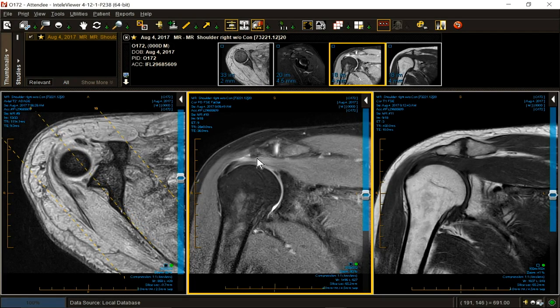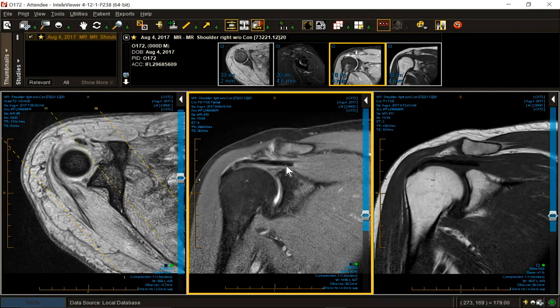There is an area of abutment of the acromion and ligament in contact, even with the arm at the side, with this area that is inflamed and irritated and has produced this, which is what? Calcific tendinitis, also known as HAD, hydroxyapatite deposition disease. So this is a weird manifestation of HAD.